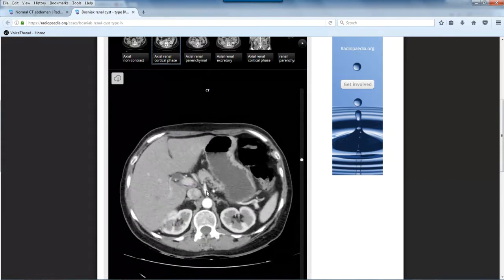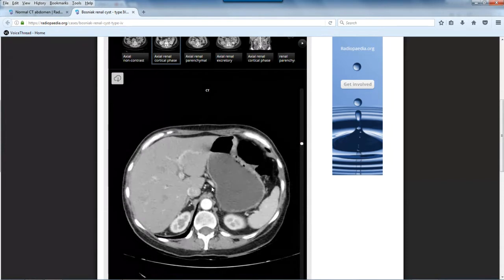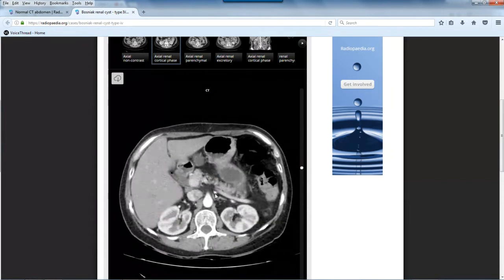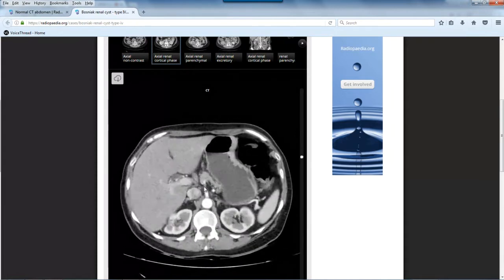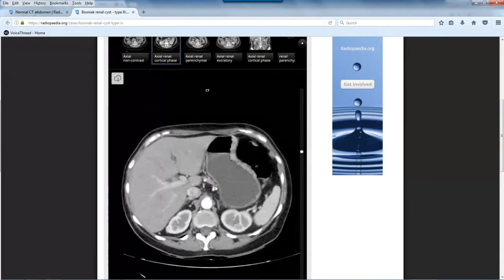The next branch is going to be your splenic, which I believe is going to branch again to the gastric. And you can follow this over. So here we go. Follow it down, down, down, down. That's actually up.